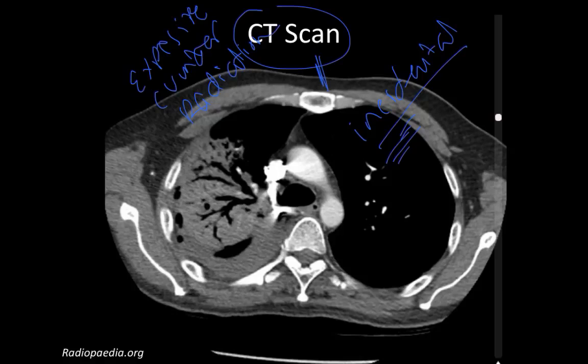But we do a lot of CAT scans, and CAT scans can show you a pneumonia really, really well, because you can definitely see how this fits the picture of a bronchial sparing alveolar filling process, which is most consistent with pneumonia, especially that it's unilateral and it's following a lobar distribution. In addition to the pulmonary infiltrate, a CAT scan will show you if there is other stuff like pleural effusion, and if there is a mass underlying the process. In this case, there is no mass, of course.